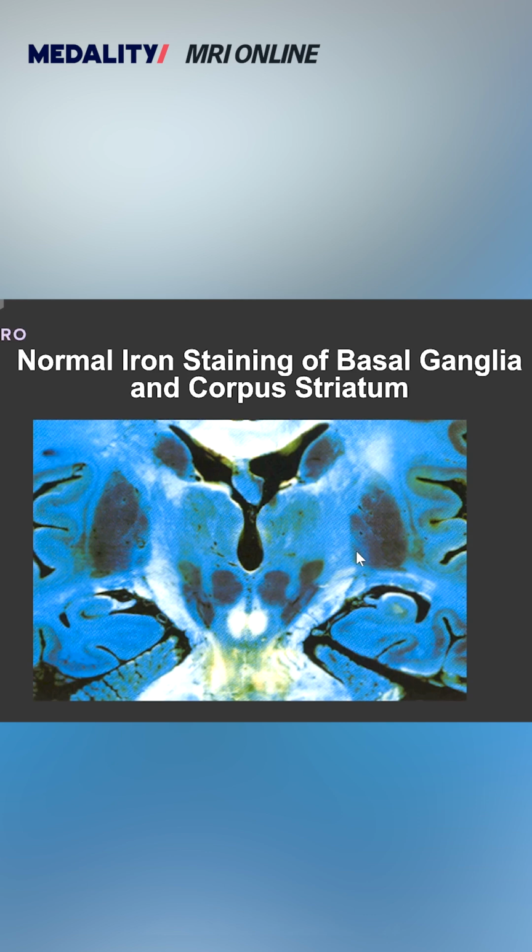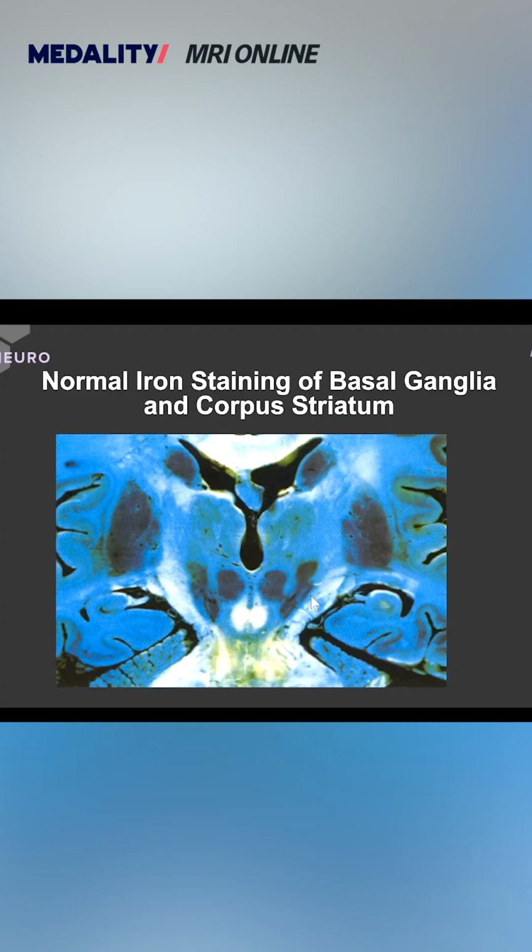Now, we're able to separate the GPE from the GPI, external from internal, and that moves us over towards the midbrain, where we have the nucleus ruber, or red nucleus, and the substantia nigra. Now, in the normal setting, we see the reticular layer of the substantia nigra, which is this outer component right here, and then the nucleus ruber, or red nucleus, right there, and they are separated by a non-stained area, which will show up less dark on the MRI because of the paucity of iron present.